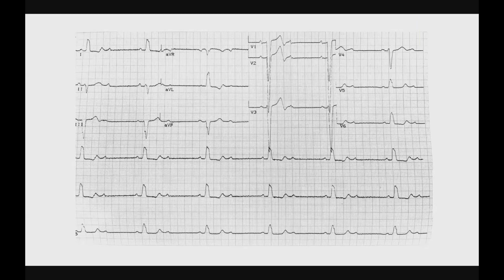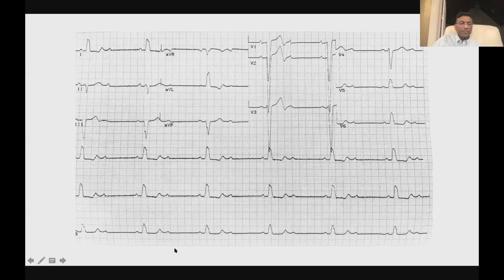Also, sir, I think I'm seeing a U wave also in the last three. I don't know which leads they are. In the last three sections, I'm seeing a U wave as well after the T. Okay, yeah, I apologize. That's V5 out here, I think. One of those. Yeah, looks like V5, V6.